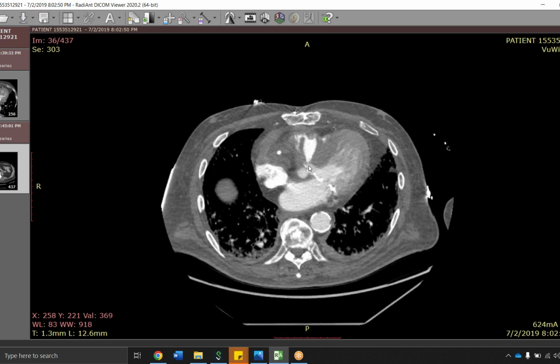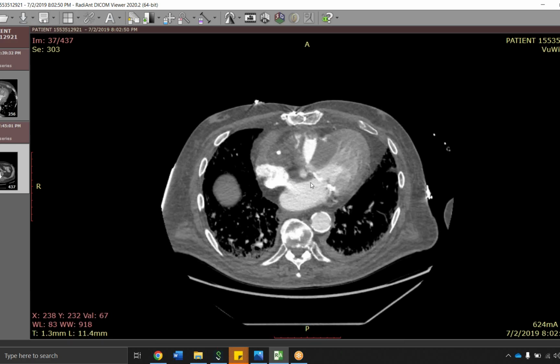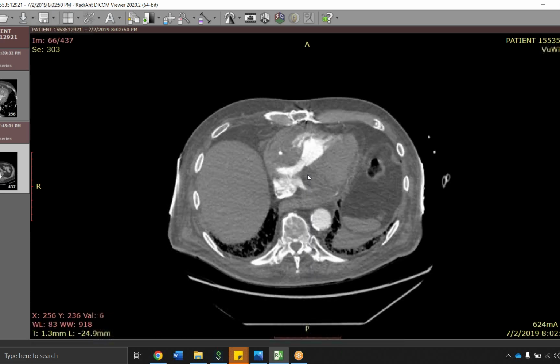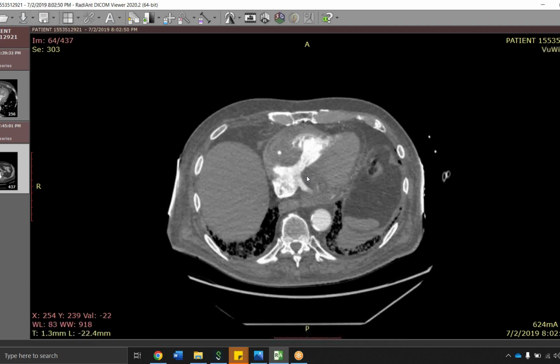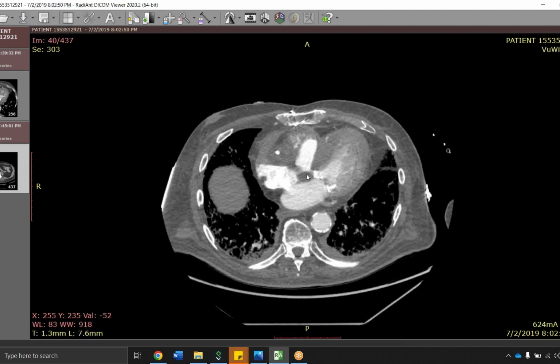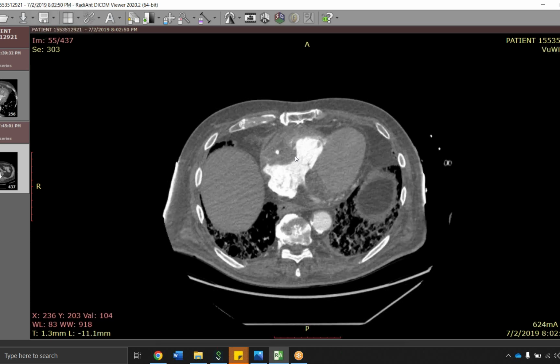This is just something that I had never actually seen the immediate post-procedural imaging of before. I'm not sure if others have as well. Presumably, this is the expected appearance, given that degree of macerating of tissue that they do. But I would love to hear if anybody else has seen this before or seen the progression, whether this all goes away eventually. It does look like it's causing some mass effect here.